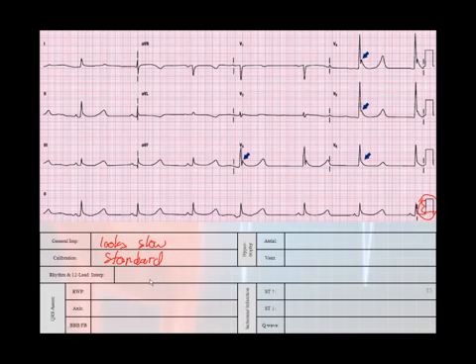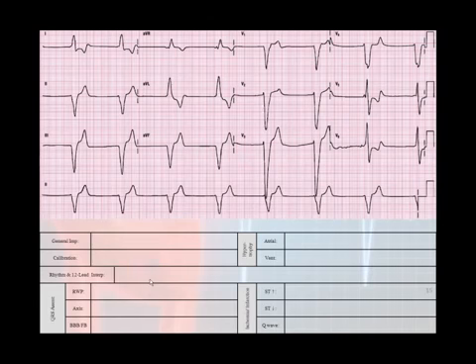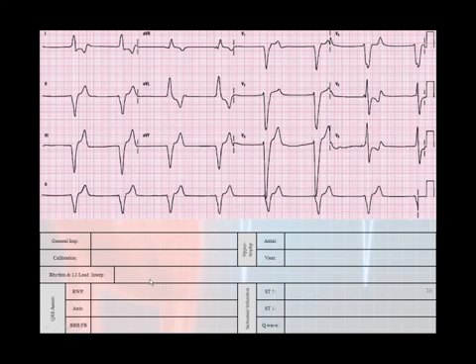Let's look at one more. It's going to be the same one that we had seen earlier, so let's look at that real quick. As you glance at this, you want to say to yourself, is it excessively fast, excessively slow, or does it have ugly morphologies? Well, in this case, we have 2 problems, because if you glance at it, it looks slow, and it has ugly morphologies. But now we want to look at our calibration.